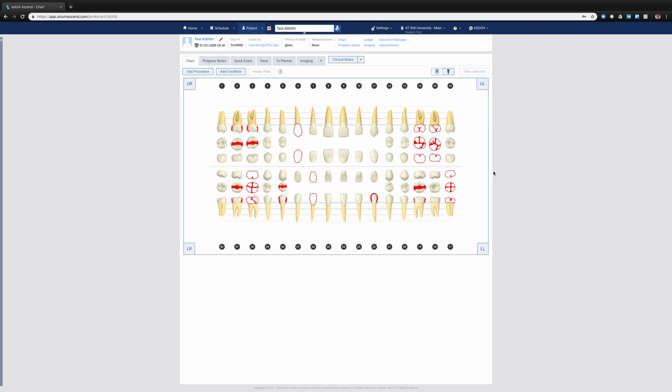Hi, this is Dr. Johnny Brennan doing a tips video for axiUm Ascend. I pulled up a test patient as a test student user logged in, and I'm in that patient's chart. I want to go through and just make sure people are aware of some of the charting capabilities. I think most are, but for those that aren't, this might be a quick, easy review.